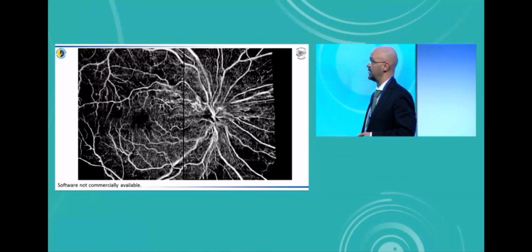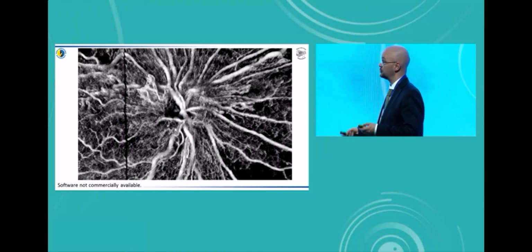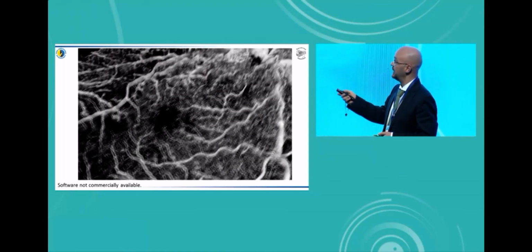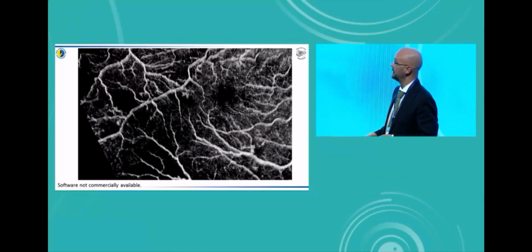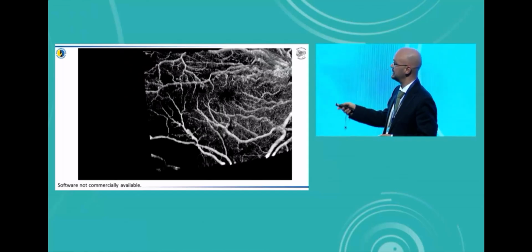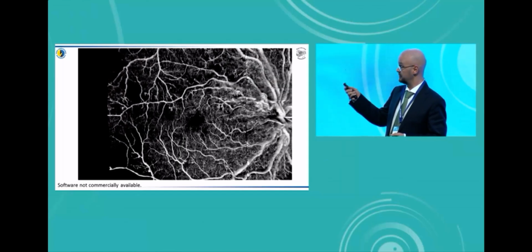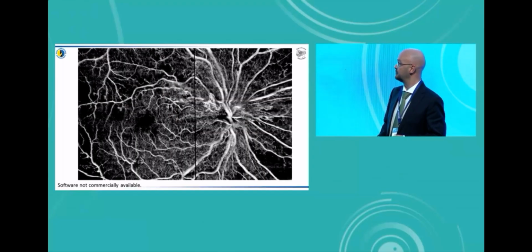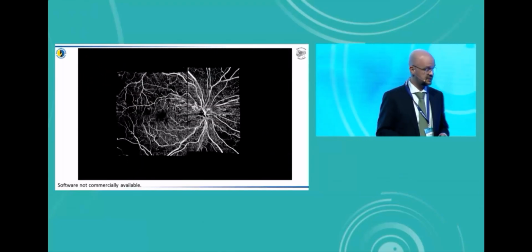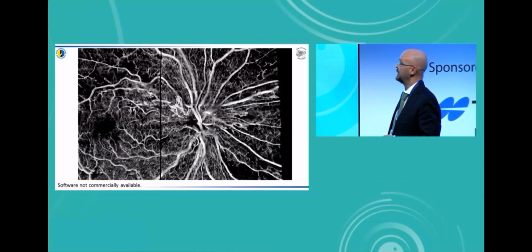What I also did is I took the three-dimensional mosaics, and it's possible to create a three-dimensional reconstruction of it. So here you have a proliferative diabetic retinopathy. And in the three-dimensional reconstruction, you can see all of the small details. In here, you've got the ischemic areas, you've got the proliferation at the disc, and of course, you have all of the hemorrhages and microaneurysms and so on and so forth.